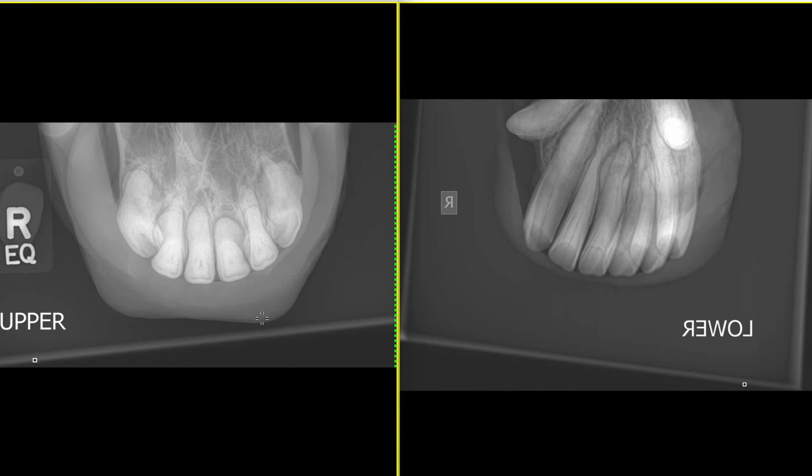If we look at our incisor teeth in the upper arcade, we can see that we've got quite blunt roots and a very broad lucent space around all of our teeth here. You can see the normal root of the 203 tooth here, but you can also see that it's surrounded by abnormal material, so amorphous, calcified or mineral opacity material, and you've got quite a lot of widened periapical space here, and you can follow this through.